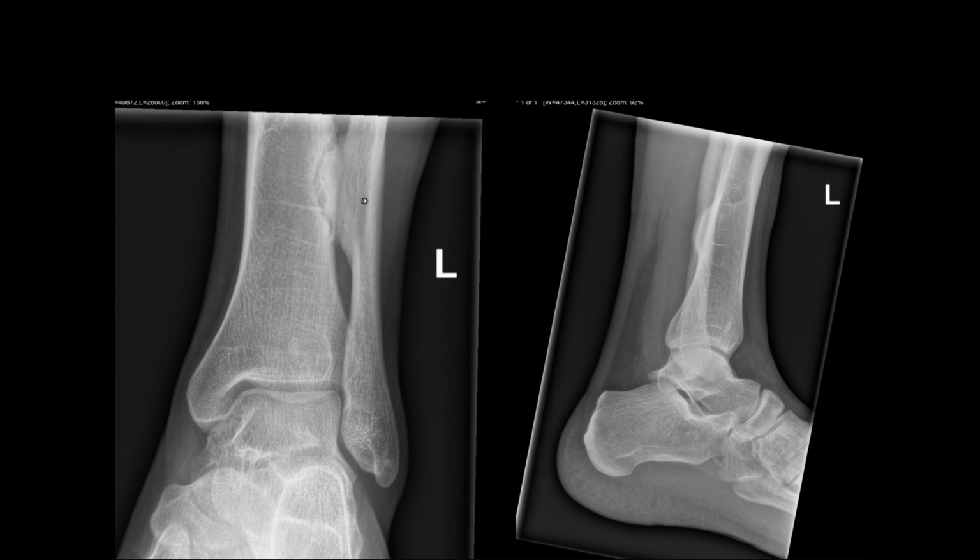So, in summary, here is a case of incidental osteochondroma, but despite being incidental, it is of clinical significance because of bone remodeling and compression effect on the adjacent bone. If it is left like this without any treatment or further follow-up, there are chances of a pathological fracture of the tibia or early osteoarthritis of the ankle joint. Hence, this patient needs further evaluation with MRI and orthopedic team opinion, and also follow-up under the orthopedic department if clinically necessary.